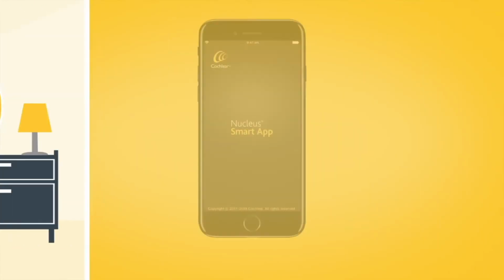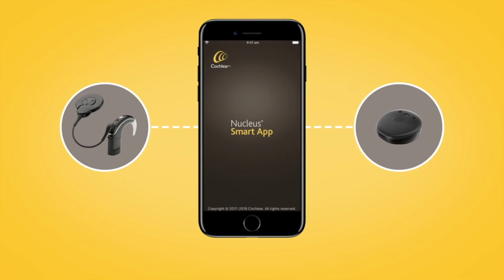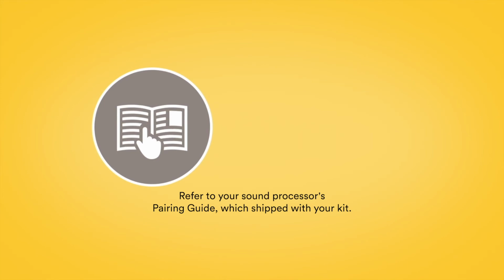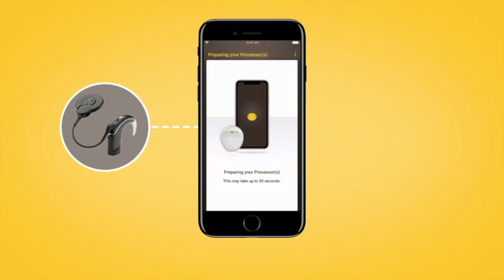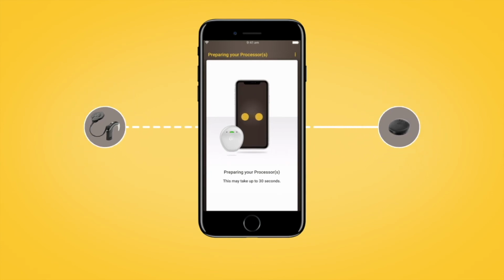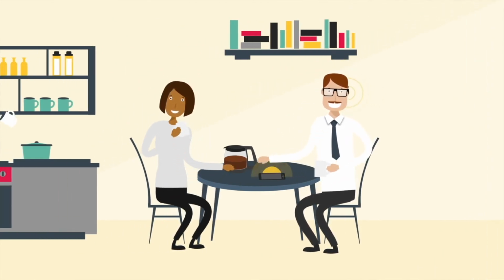To start using the Nucleus Smart App with your Nucleus 7 or Kanso 2 sound processor, you'll need to pair your sound processor to your compatible Apple or Android device. To pair your sound processor, follow the instructions in your sound processor's pairing guide or watch the How to Pair animation. Once you have paired your Nucleus 7 or Kanso 2 sound processor with your compatible Apple or Android device, follow the instructions with the Nucleus Smart App to set up your processor. When setup is complete, you will be ready to use the Nucleus Smart App with your Nucleus 7 or Kanso 2 sound processor.